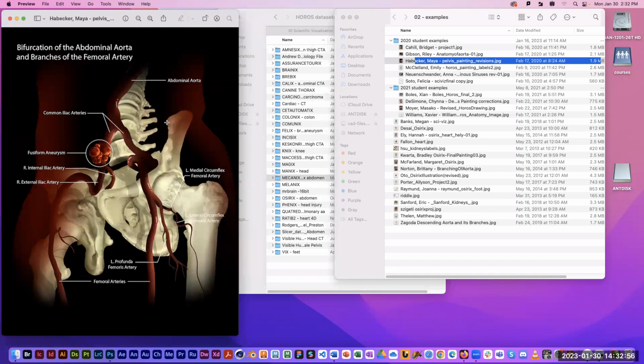Here's another one that's got some visual drama. We're looking up from below. Reminds me of this kind of an obscure movie reference, but the movie Citizen Kane. There's a scene at the end where I think it's Kane himself is like throwing a tantrum and throwing furniture around the room, and the whole thing is filmed from the ground up. So you're looking up at this guy having this tantrum. And it heightens the visual drama of an image when you're looking up at something from below.